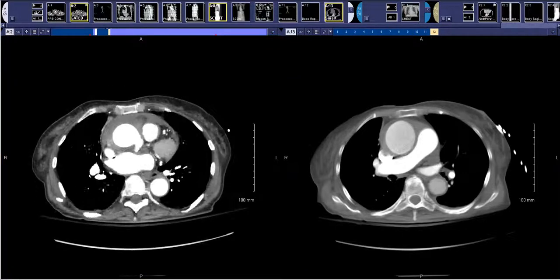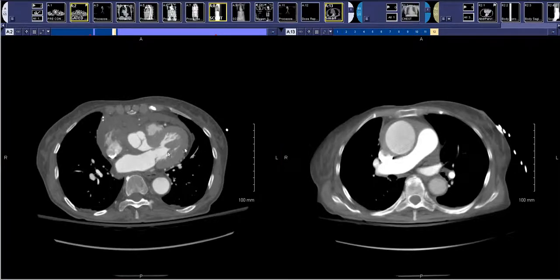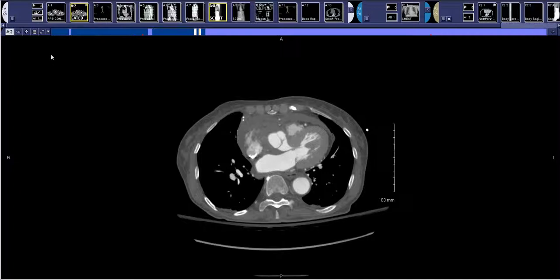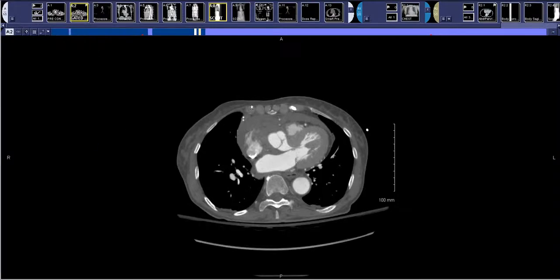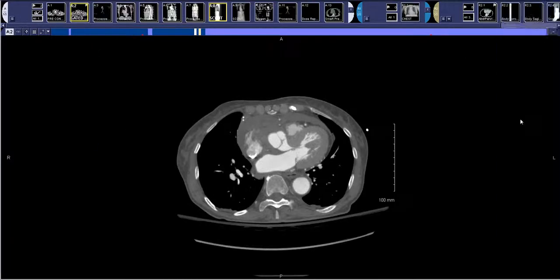When I read an aorta CT, I always start at the base. You start at the aortic root, and then you go all the way through the bifurcation. To look at the aortic valve plane, I like to do multiplanar reformatted images. If you click this button in the top left aspect of your McKesson screen and go to 3D, you can do a MIP, you can do a color image, or what I like to do is use one of the presets and do a 3D MPR layout.